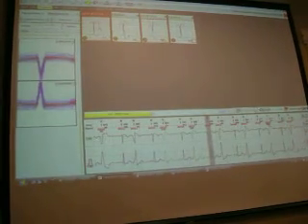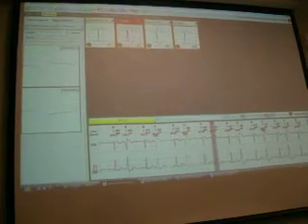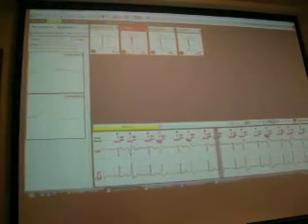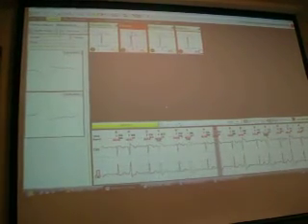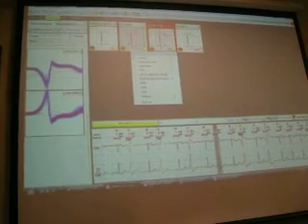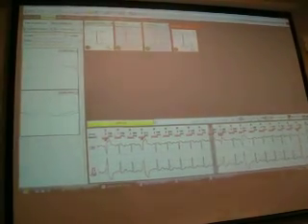On the first cluster, we can see that the type is normal, I accept it. On the next, the type is set normal, but checking the QRS, I suppose that this is rather ventricular, so I rename it ventricular. The next is also ventricular, and the last is normal.